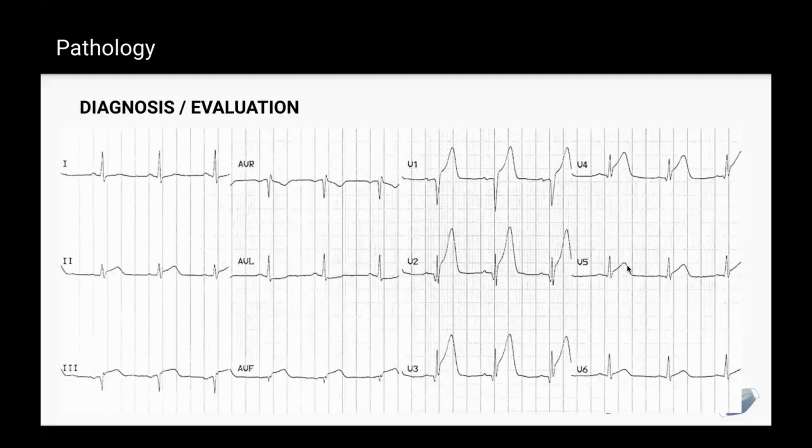5, a tiny bit. It's a little up, but it's not too awful. I would say that the main ischemia is probably somewhere between V1, 2, 3, and 4, which are probably the biggest ones. Does that make sense, guys? Do we see that?